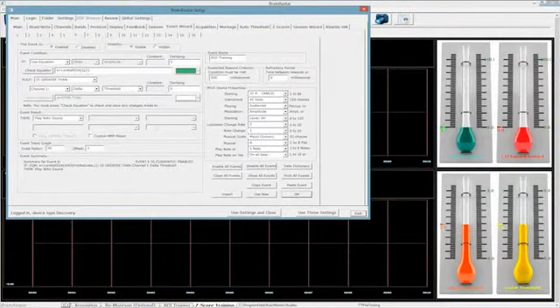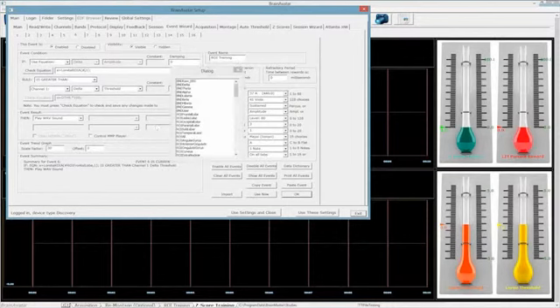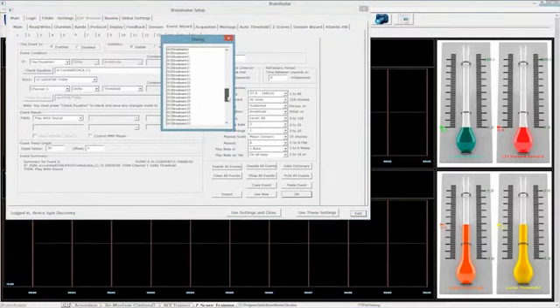The final one is the GUI implementation. And that is basically by hitting the pound sign, you will open up a special graphical user interface. That is this right here. And it allows you to open up and choose from here what you would like to choose.